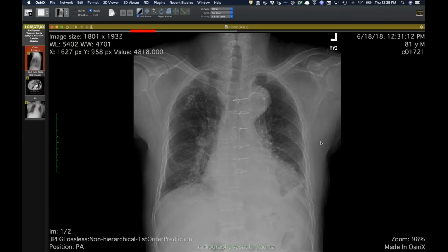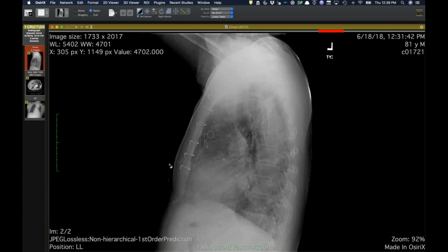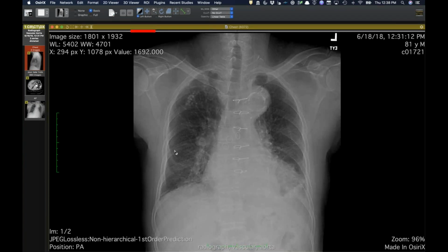More radiographs, and this is one that I've held for a while. I've shown other examples of this, and this is kind of interesting. This patient who's 80 plus has had a prior coronary artery bypass grafting. They have a lot of atherosclerotic calcification of their aorta, and not surprisingly, they have a known type B dissection. We can see the displaced intimal calcification, or at least this increased rind of soft tissue around the aorta, as you can imagine, just thickening of the wall from the chronic dissection. And you can even see it a little bit on the lateral here between the calcified portion of the aorta and then the non-calcified portion.